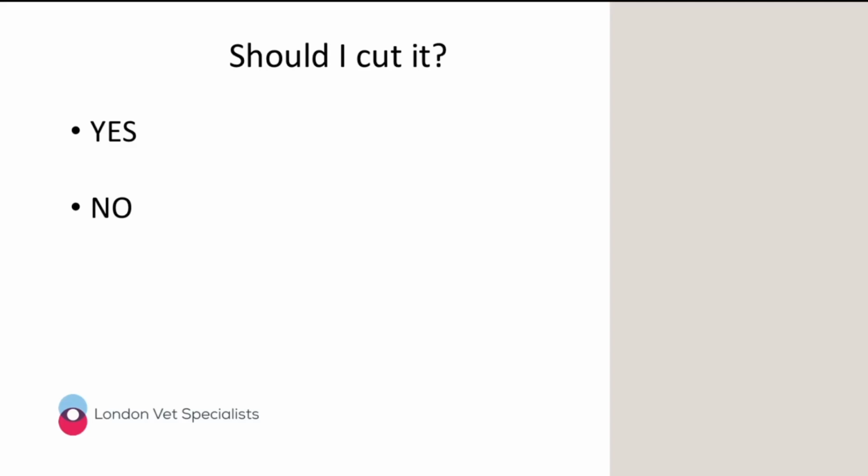So for those of you who decided to wait it out, in this case, you would have been right to do so. We repeated the ultrasound scan of this dog 24 hours later, and that foreign body wasn't visible. And this dog made a complete recovery just with symptomatic medical treatment. So this patient didn't need to have an XLAP.